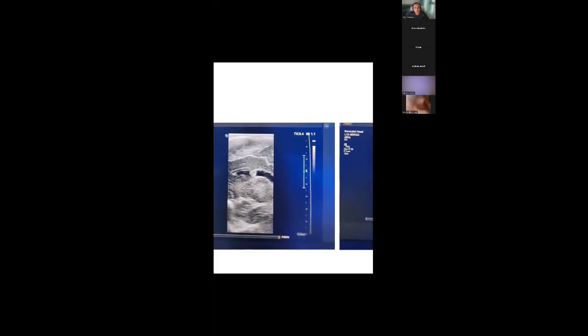It'll be very interesting if you were able to follow this up and it developed cystic change, then really it could be a bleed. But if it just remains like this for the rest of the time, isodense, without any changes, without any problems, it's just an isolated detachment of the choroid. Nothing that I would worry about.